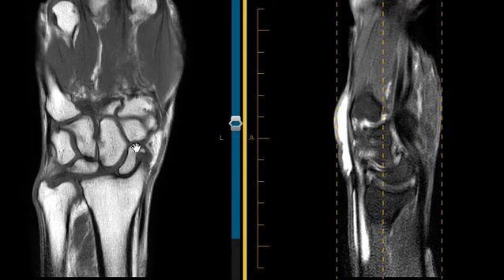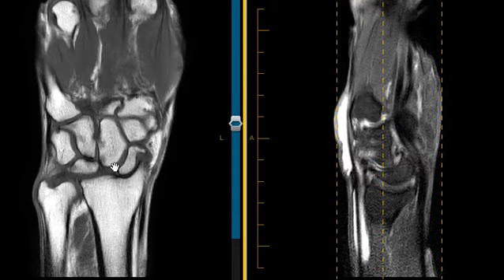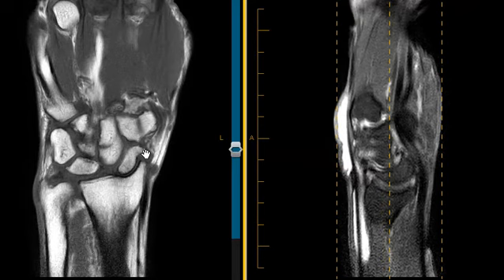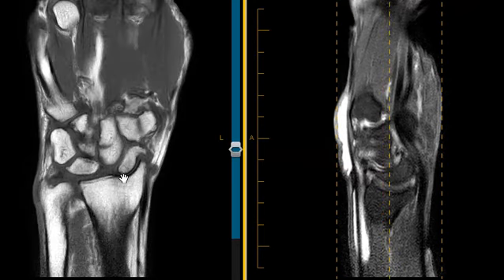And also this scaphoid bone is abnormal. It's all deformed, small, and has contour irregularity. Normally it's bigger and smoother. And so this is chronic erosion from the abnormal mechanics of stress. This has also eroded the distal radius. The radius, instead of having a flat, nice articular surface, has a scooped out area. So this scaphoid bone is being driven into this and it chronically eroded that bone.